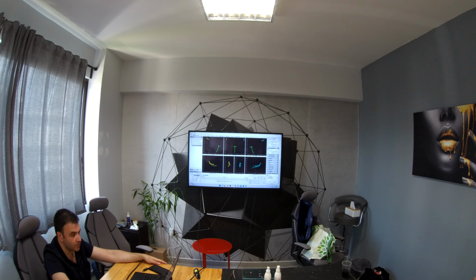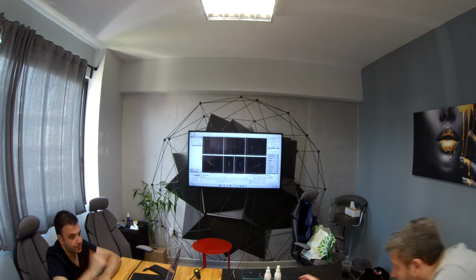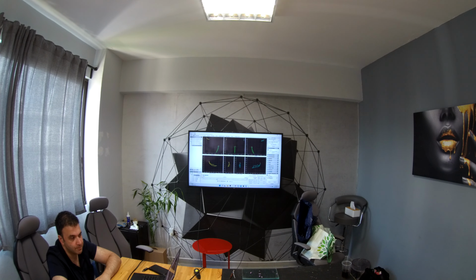So remember our art control movement. Let's see how it looks, how we did see it. Yes, we did see it like this. And we can, if you press control and left mouse button, just do some measurements. Like 41 millimeter of mouth opening, normal range, yes.